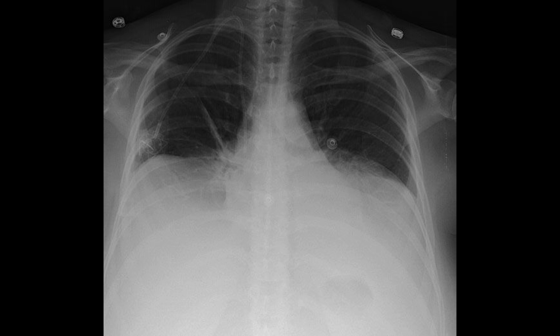This is a chest radiograph of a middle-aged woman with a known history of omental carcinomatosis who presents with progressive shortness of breath. The frontal radiograph shows an increased distance between the stomach bubble and the left lower lung, measuring more than 2 centimeters, and the right diaphragmatic peak is displaced laterally beyond the midclavicular line.